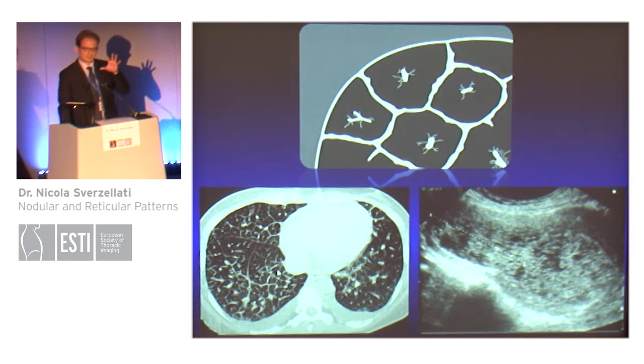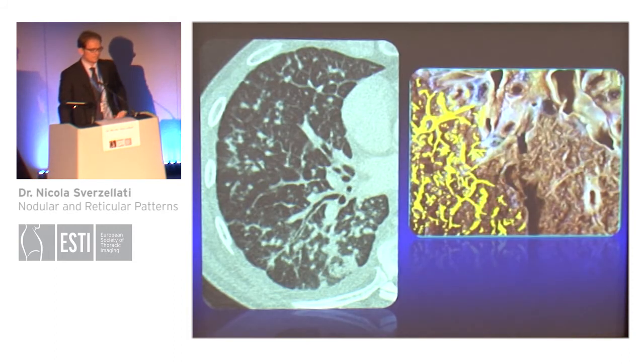So when these smooth septal lines are unilateral or very patchy, and if we know about the presence of a cancer somewhere, we should also consider lymphangitis. So sometimes the differential diagnosis between these two different conditions is not so easy. Of course, if the interlobular septal thickening is more irregular and even nodular, then we can more confidently diagnose lymphangitis.